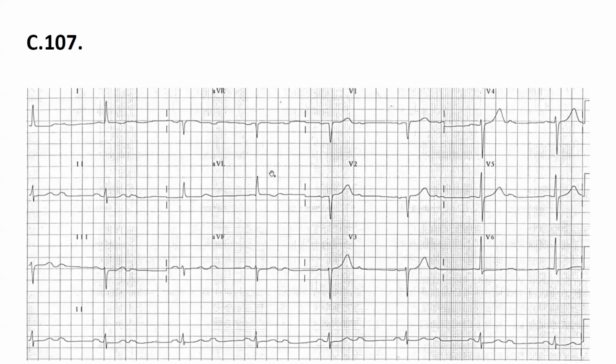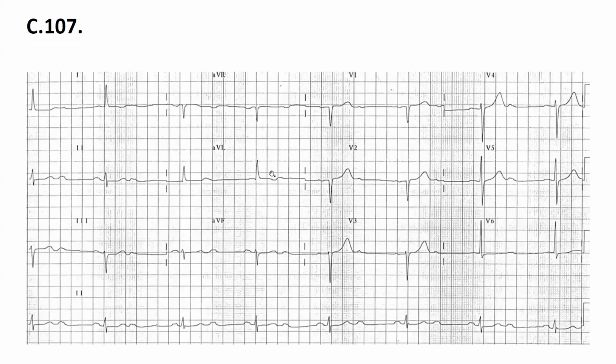Okay, and this is the next one. Ratnali, hi there, your turn. So the rhythmicity looks rhythmic. Is it a normal sinus rhythm? It's a sinus rhythm, but not normal.